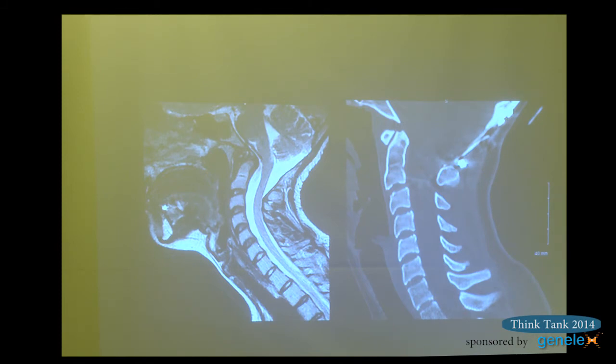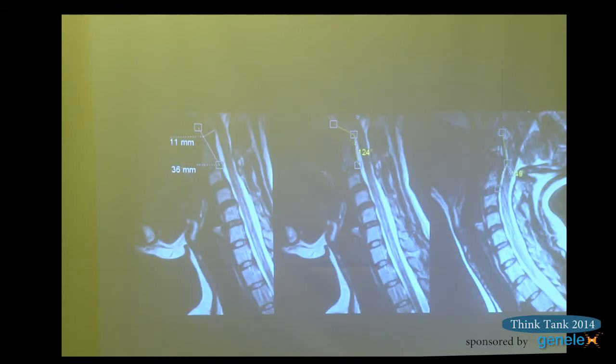This is somebody post-op who wasn't stabilized, and again had abnormal clival axial angle with impingement. Again, showing someone else. Can you actually see the structures here? From my angle, I can't. But it's a Grabb-Oakes measurement of 1.1 centimeters, clival axial angle of 124 degrees. That's an abnormality. It's too much. And on the extension or tipping the head back, it goes from 124 degrees to 149 degrees. This is normal range. In extension or tipping back, there's impingement.